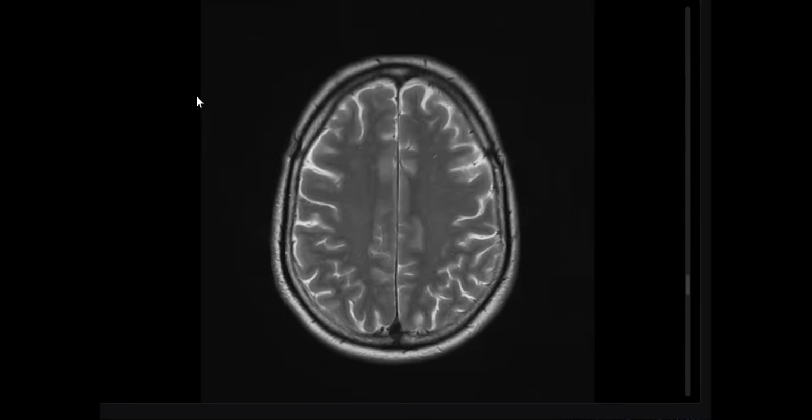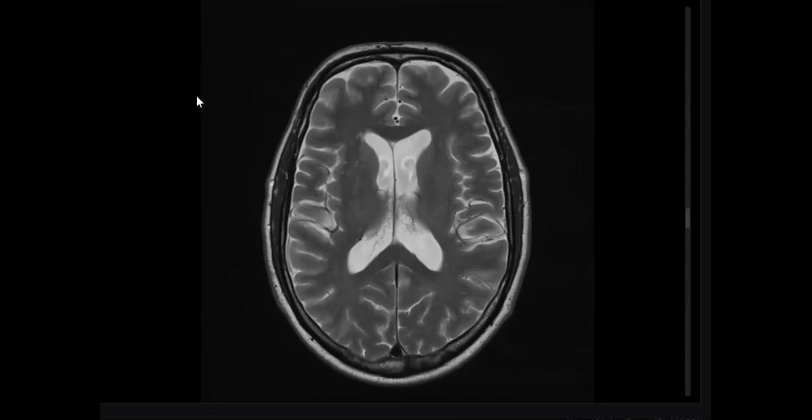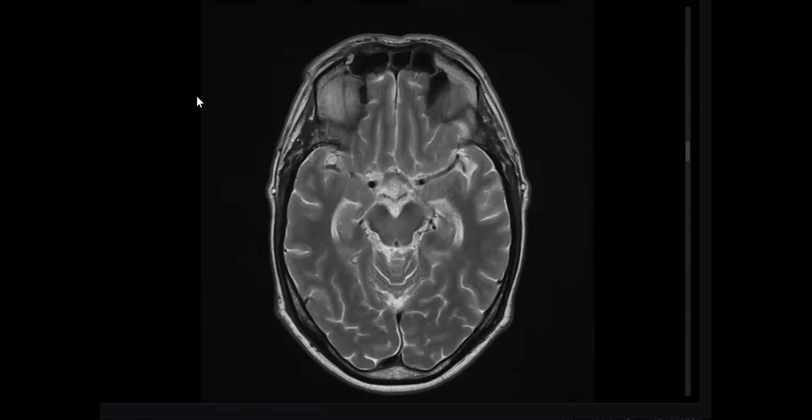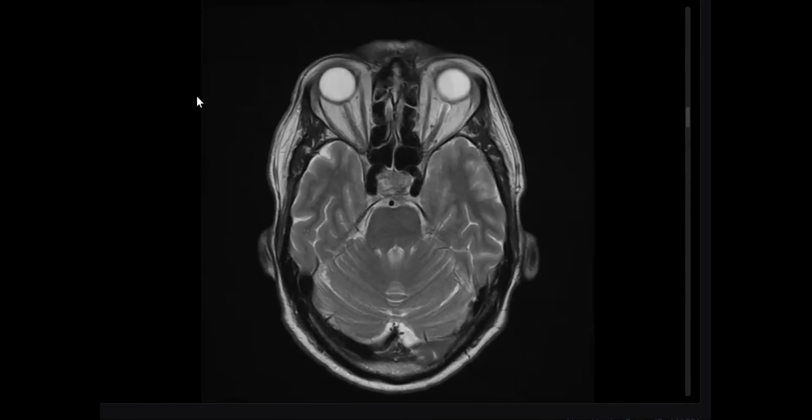Can you scroll down, please? A little bit slowly. Severe headache. Yes, I'm trying to spot any. Okay. A general question.